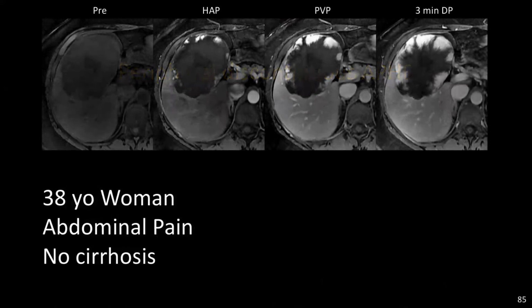We see a large mass. Notice that we have globules of enhancement. Notice that these globules of enhancement are discontinuous. They are not touching. Notice that over time, the globules get bigger and expand. And as they expand, they're following the blood pool. Notice that the area that initially was enhancing holds on to contrast.